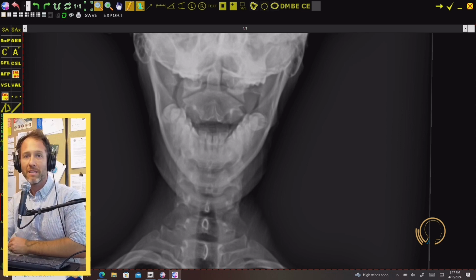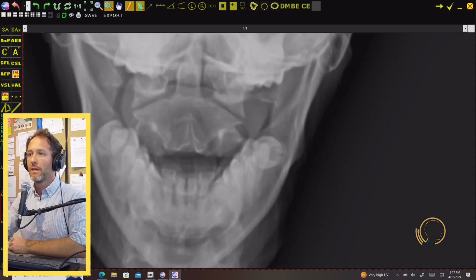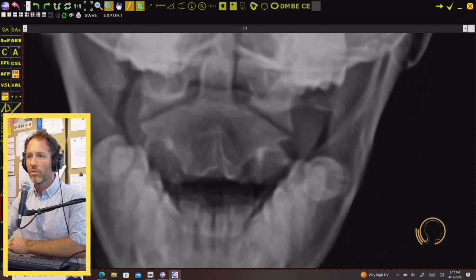So if you're sloppy with how you took this film, or you're in a rush, or you're not accurately measuring the axial circle, you could be butchering the height that you're adjusting somebody on. And if you're not getting patients clearing out and holding their adjustment, this may be something to look at. So check it out. If we zoom in here, I'll give you the traditional way, when you come to a seminar, how we all learn it, and then sort of my workflow.